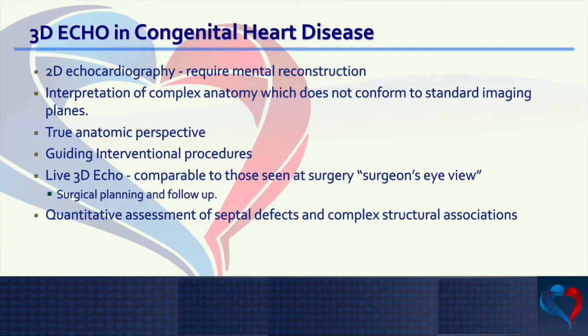Looking at the mitral valve with three-dimensional echo is really important, especially in congenital heart disease, because 2D echocardiography requires mental reconstruction, while the interpretation of the complex anatomy of congenital heart disease usually does not conform to standard imaging planes.